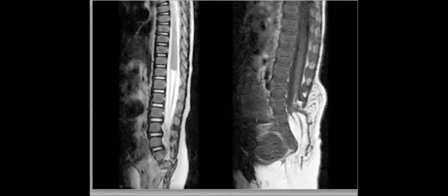Abrupt termination. These are the types, type 1 and type 2. Okay. Truncated cord. Yeah, it's called a truncated cord. You mentioned that the cord is low lying, right? So what is it called when you find that the cord is low lying, below which vertebra is abnormal? Below the inferior end plate of L2. L2, perfect.